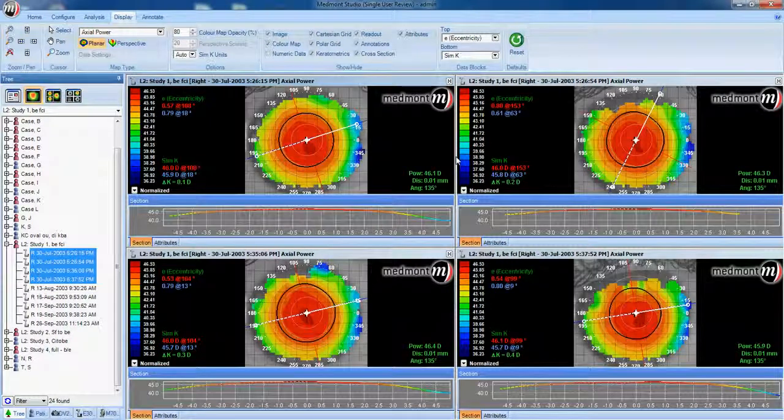This is video 9 on the practice of orthokeratology with your Medmont E300 corneal topographer. Start with 4 quality baseline maps and highlight those 4 maps on the database side, and then analyze them for quality. Look at the 4 of these images.